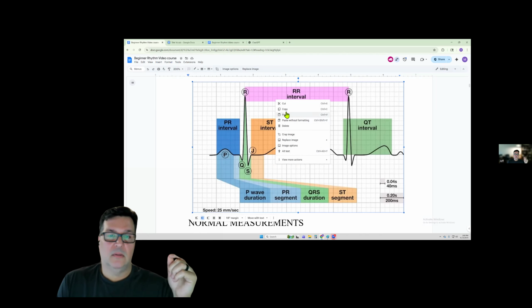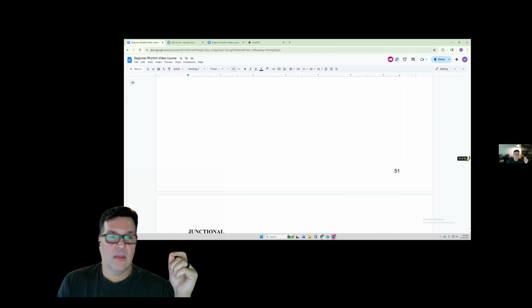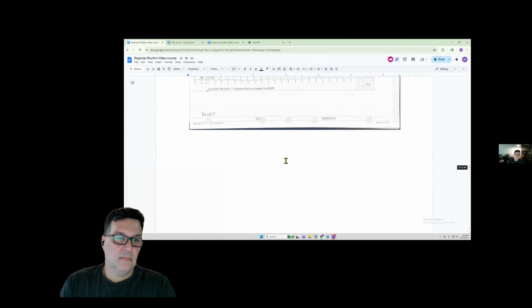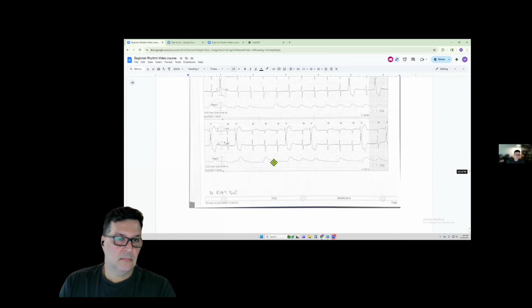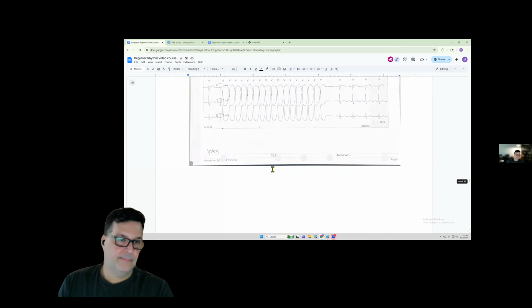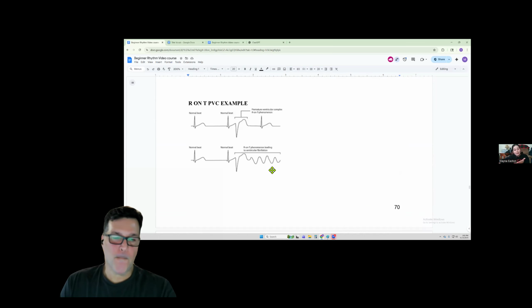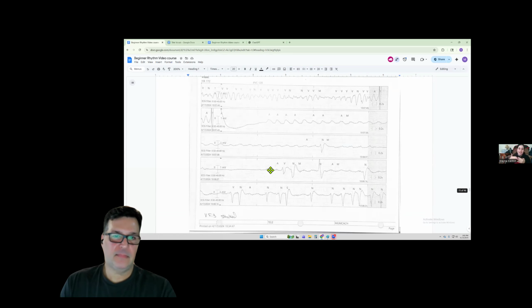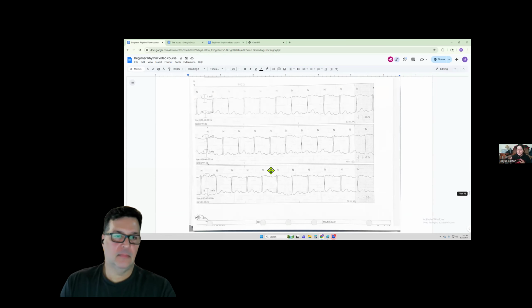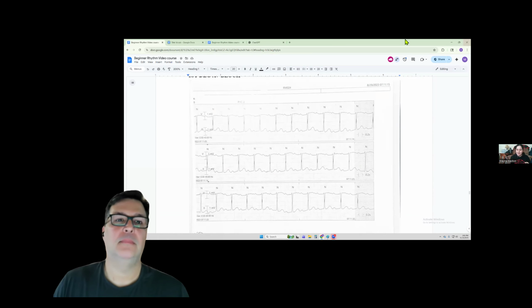Let's go. See, I need 3 pages now. And just while you're looking, the AV blocks are another one that I probably have notes in this book about, but when I'm looking at the strips and trying to discern what is what, I need to know more about why and what's making it this way because, yeah.